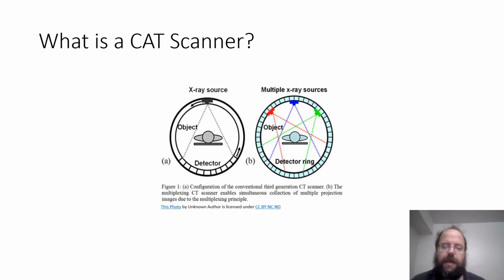All right, so here you see in this image the different ways that a CAT scanner can image. On the left, you see the traditional older style, which is where you literally would just move the X-ray scanner back and forth around the patient, and as you slid the patient inside the machine, the detectors would pick up the X-ray radiation and they would build that image. The computer would use that to construct the image.